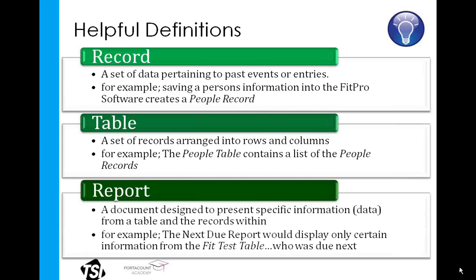The report is where our attention is going to be focused in this webinar, and it is simply a way of showing or displaying those records from the various tables in a fashion that's easier for us to read and arrange. Note that the report is not the actual data or records or table. It's just a visual representation of those things. Anything we change in the report function, edit, delete, create, it doesn't matter, none of it will actually affect the data. It can all be undone.